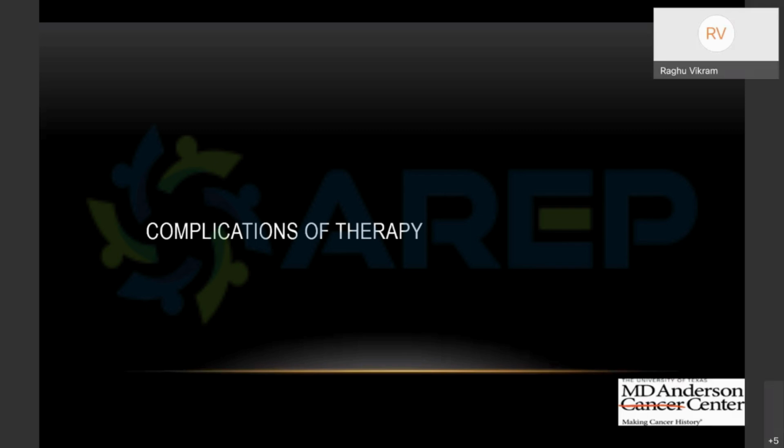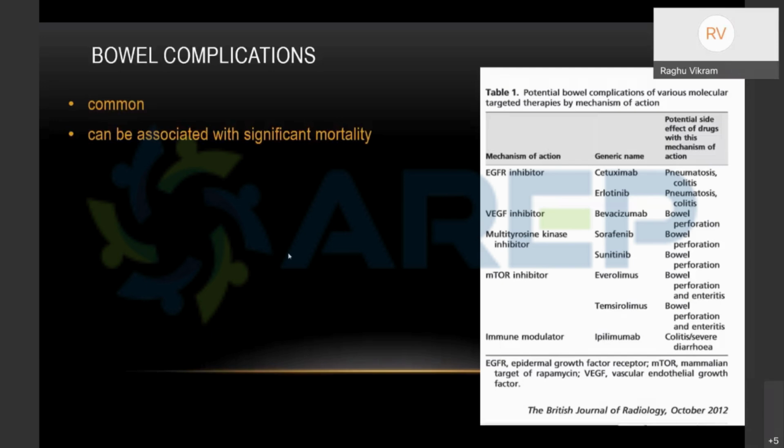We don't take any trauma or anything. We just take patients who are our patients to our ER. So most of our patients come with complications of therapy. What are the common complications of therapy, particularly when you look at molecular targeted therapy? That is, the VEGF inhibitors or the EGFR inhibitors or everything. Most common is going to be pneumatosis coli or bowel perforation. You can see that, right?